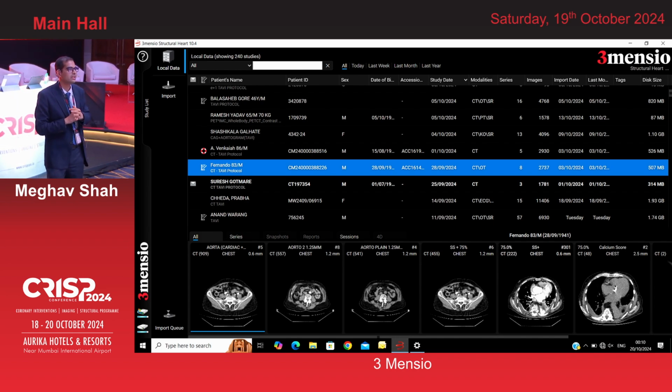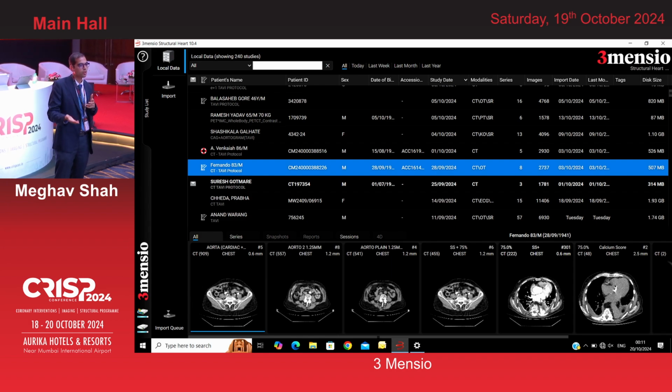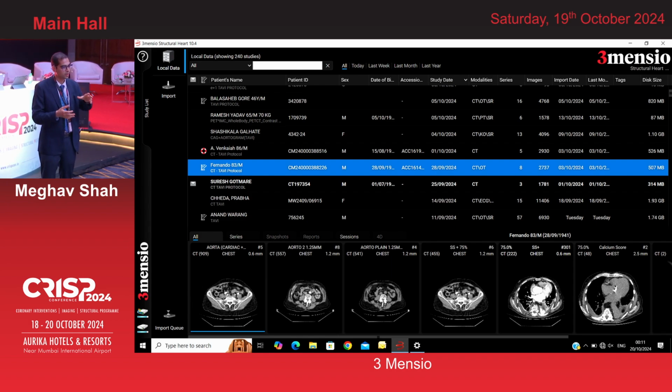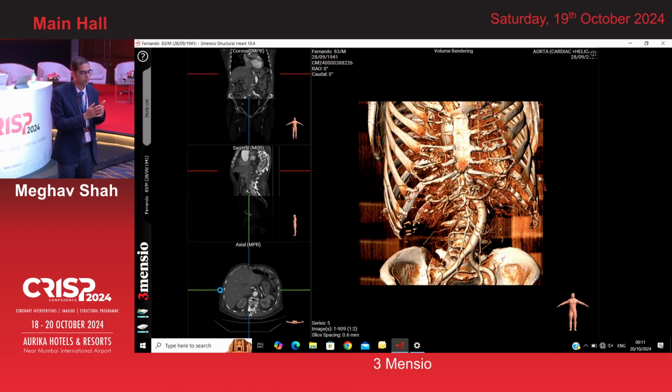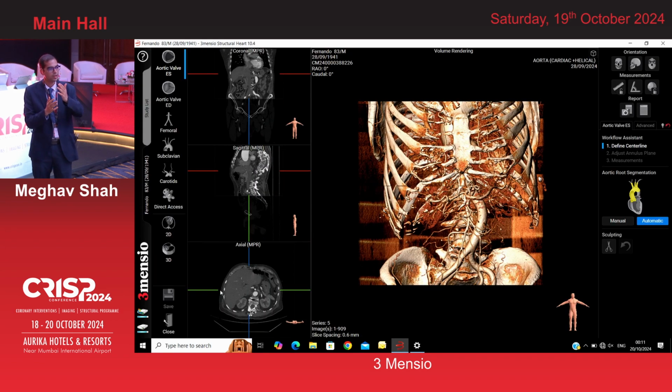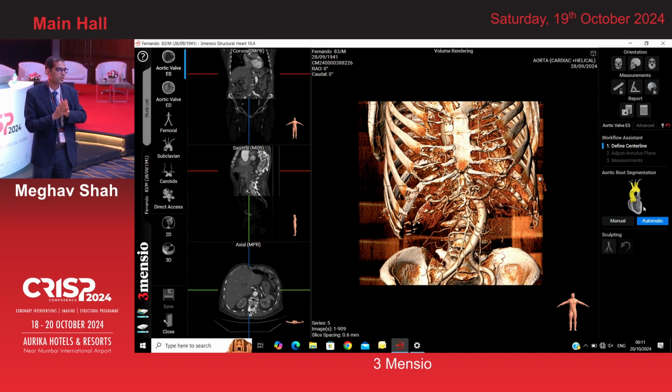Many a times what happens is on the CT we get some angle, but when we actually take the fluoroscopy, like we take the cine of the aortogram when the patient is on the table, you find that the cusps are not aligned. Then you have to chase the right cusps and get the coplanar view and only then deploy the valve, because otherwise your valve deployment will not be parallel to the annulus. So that's very, very important, and more so for self-expanding valves than for balloon expanding. It can be very unforgiving.